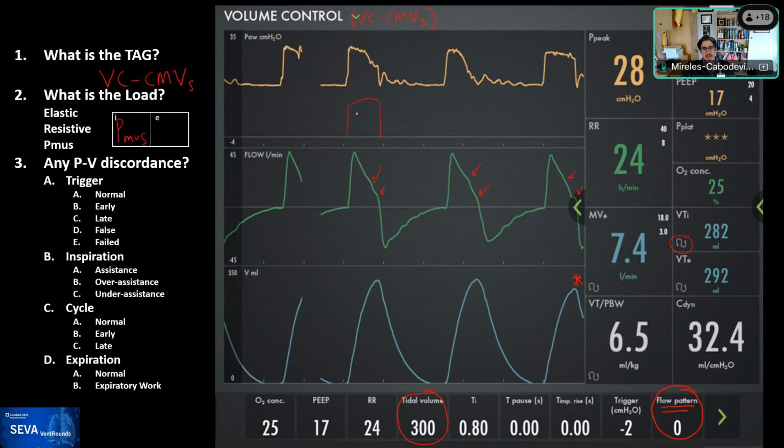Now, if you see breath number 1, breath number 2, and breath number 3, are those similar? No, not at all, right? So you can see that they are different. So remember what we said with the equation of motion, and this is an important knowledge. So now you have here how it should look.